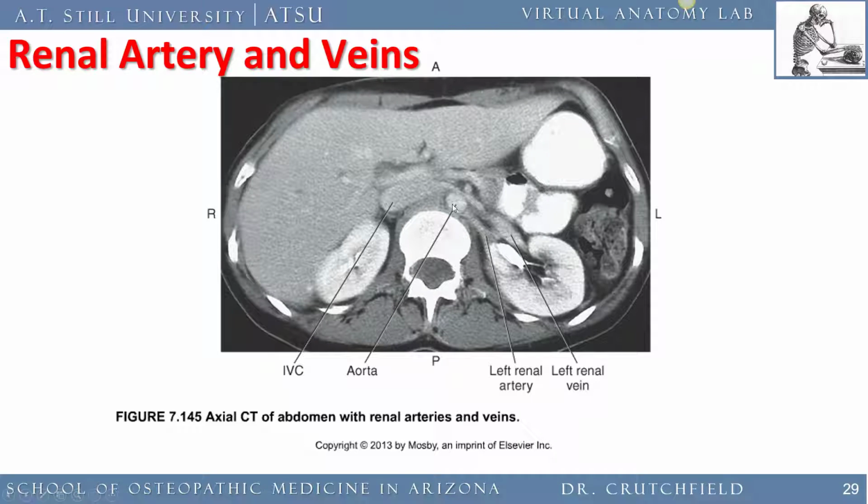So I think what we're seeing here is the aorta with the left renal vein and the superior mesenteric artery coming directly over that left renal vein in that classic relationship. And it does look a little pinched here. If this had varicosities with it, we could make an argument that this was nutcracker syndrome.